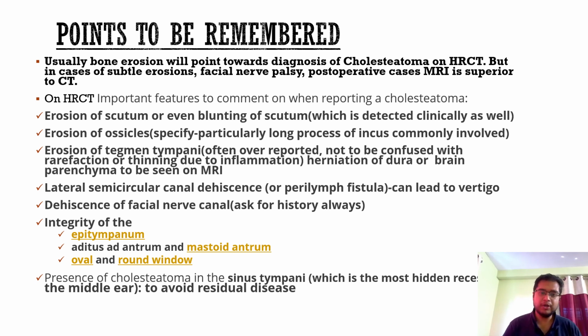Why is this happening? It is because tegmen tympani is a very thin bone, and often because of the chronic inflammation, there is some thinning or rarefaction, further thinning and rarefaction of that bone, and it is over reported as tegmen erosion. This is very important that you look for it properly on all the sections, whether there is actually proper erosion or not.